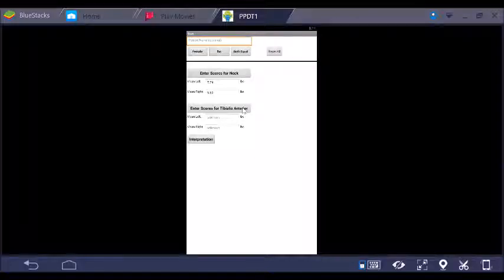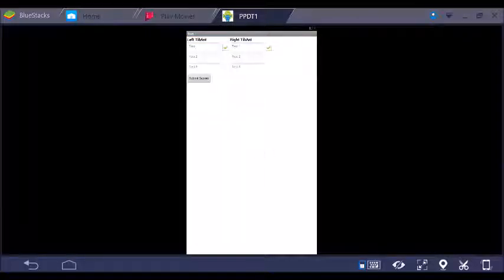Okay, now let's imagine I go down to tibialis anterior, and we do the same thing. So let's say we start on the left side, and I enter, and I get 12.76 pounds. Maybe I do the right side, maybe I don't, but let's just put a number here. It's going to want me to put something in, so I'll just put 10.76 pounds. I go back to the next one, and say the next one on the left side, I do again, and I get 18.98 pounds. Now we know already this is going to be on the standard error, so it's going to ask me to do a third test on the left side. We'll say the right side, let's just make it up, and we'll say it's 11 pounds, so they're within very close range.